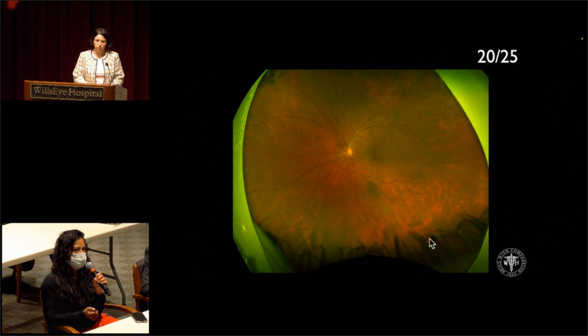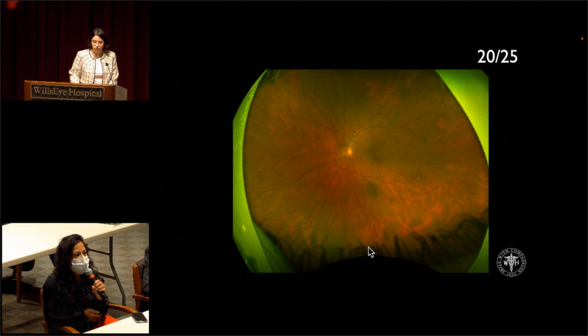Yeah, it looks okay. And then here we have the left, same imaging modality in the left eye. Visual acuity is well preserved at 20/25. Media looks clear. Disc margin looks sharp. Overall vasculature looks normal. We do see this hyperpigmented lesion just outside of the inferior arcade, with some overlying drusen, could be a nevus. It doesn't look elevated. I don't see any subretinal fluid. And then the visualized periphery looks normal. I don't know if these are just pigmentary changes out here, but overall looks pretty good.